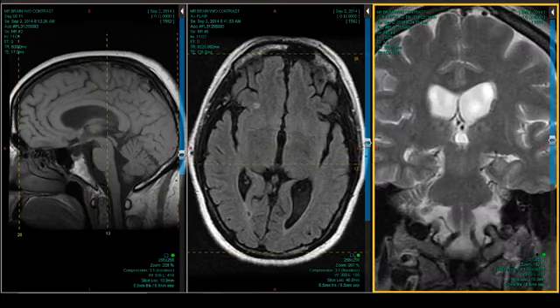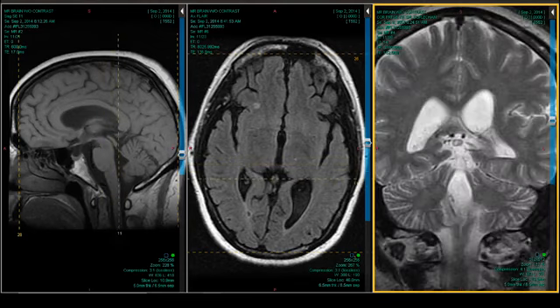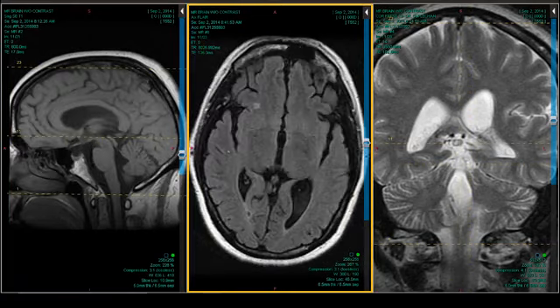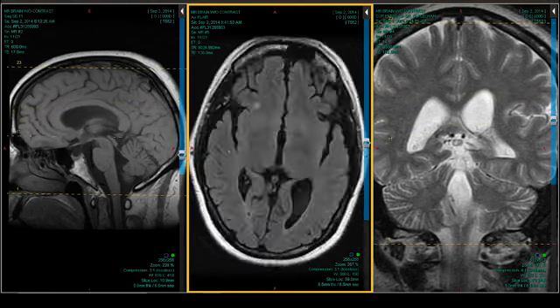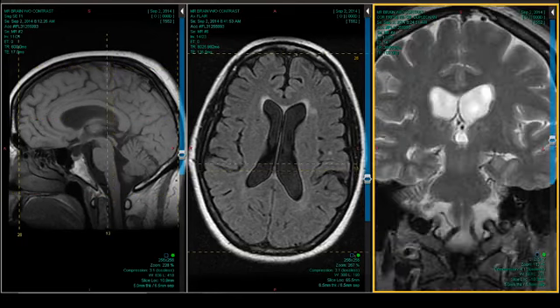You have to backtrack on that a little bit. I haven't looked at the answer to this one intentionally, but there is a little bit of vascular disease. Not enough to cause dementia. What's the chief complaint? Speech disturbance, and cognitive disturbance.